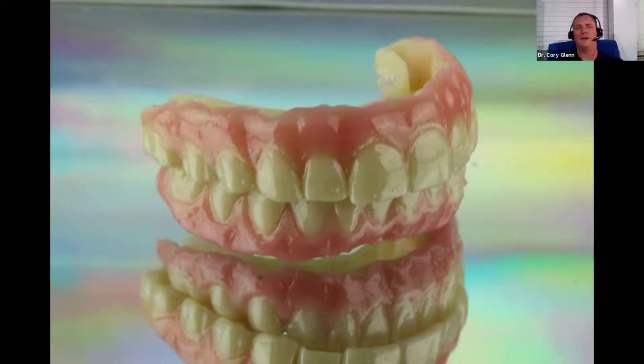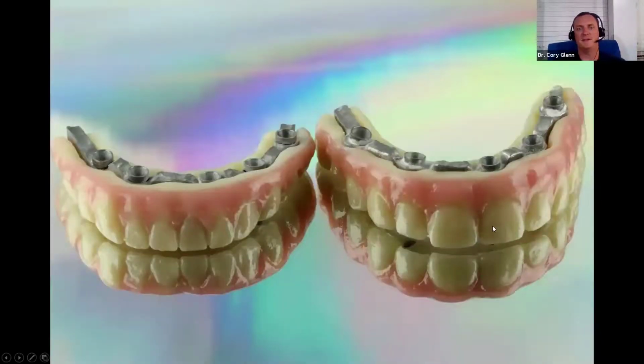the top of that. So in my case, I used the denture module to bring in a full dentition of teeth, upper and lower. And I designed a gingiva on it. And I used the crown and bridge to dial in occlusion and everything. And then I just did a Boolean subtraction of the intraoral scan of that bar and came up with this. Okay, so this is how it's going out to the doctor.